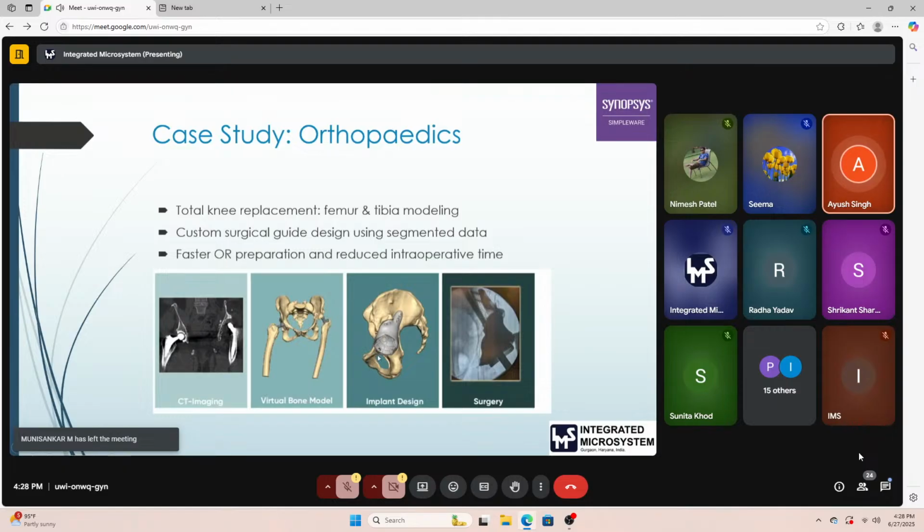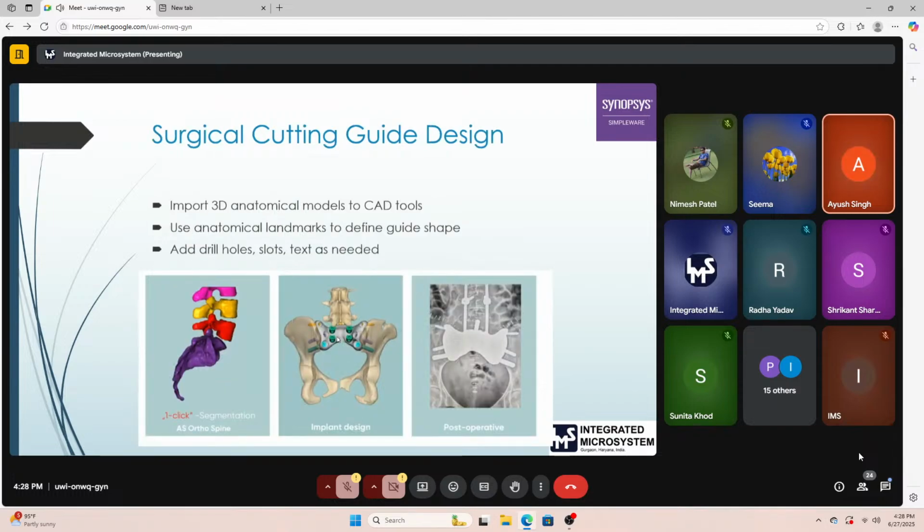There was a requirement of generating a fresh implant to change the old acetabular cup implant, and once this was done using Freeform, we had done the attachment and placed the particular positioning accordingly. And once it was done, it has streamlined the process and reduced the turnaround time by a significant margin.